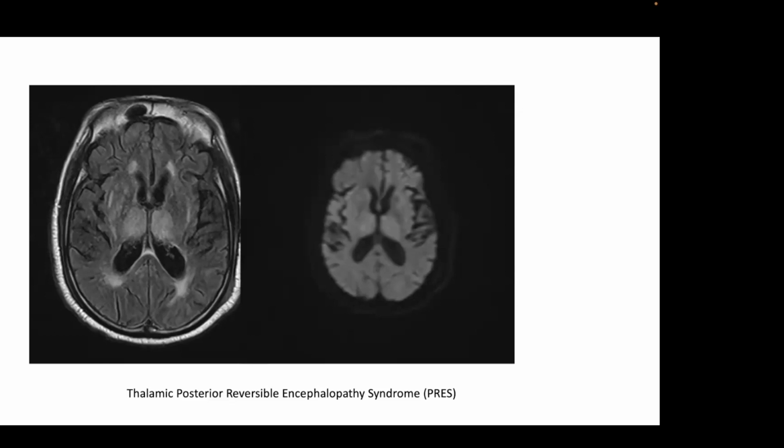Okay. I'm going to go through mostly MR venogram because there are so many artifacts on MR venograms. And I would say, depending on your experience and your imaging site, there is a tendency to gravitate towards CT venogram because it's just easier to read and there are fewer artifacts. So if you're not experienced with MR venography, then I think just go to CT venography. You're welcome, Anna.